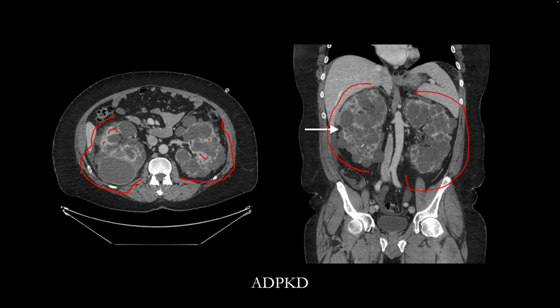When you encounter such a study, make sure you measure the dimensions of the kidney and report the volumes of both kidneys separately. That's important in their management and treatment.